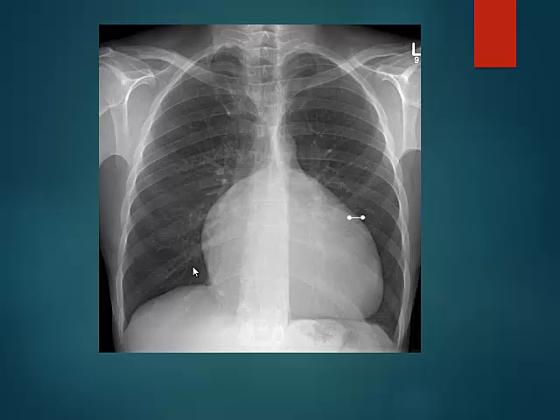Pulmonary hypertension could be. Tetralogy would not cause right atrial enlargement. But think of tricuspid valve regurgitation from some cause, or right heart failure by itself, primary RV cardiomyopathy.